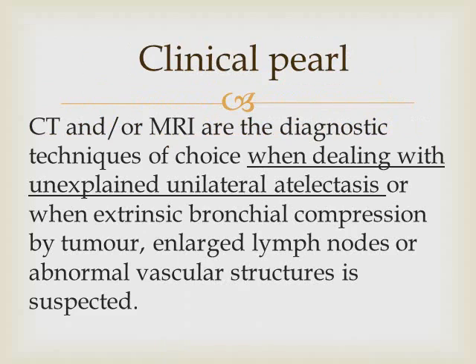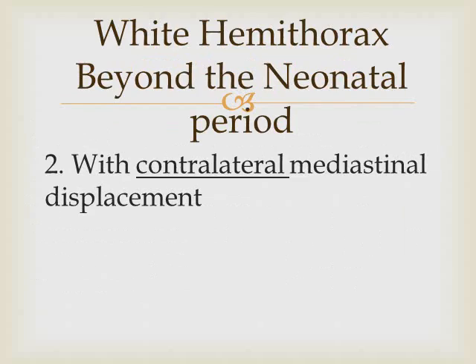So CT and MRI are the diagnostic techniques of choice when dealing with unexplained unilateral atelectasis or when extrinsic bronchial compression by a tumor, enlarged lymph nodes or abnormal vascular structures is suspected. So, causes of white hemithorax beyond the neonatal period with contralateral mediastinal displacement.